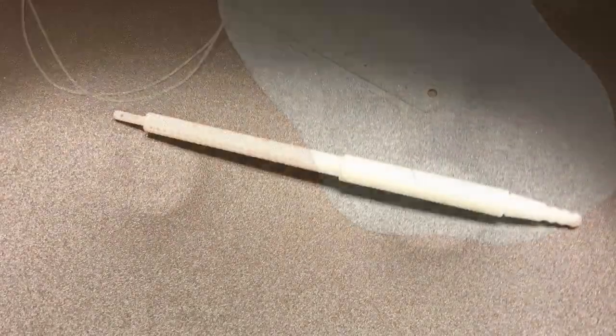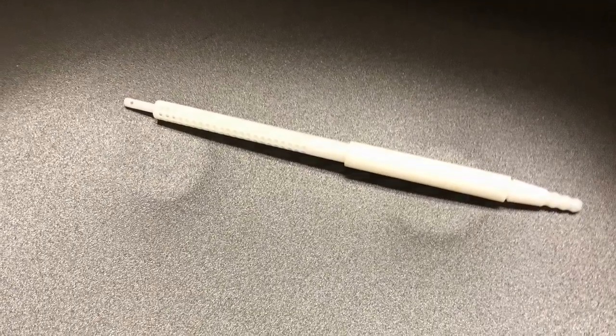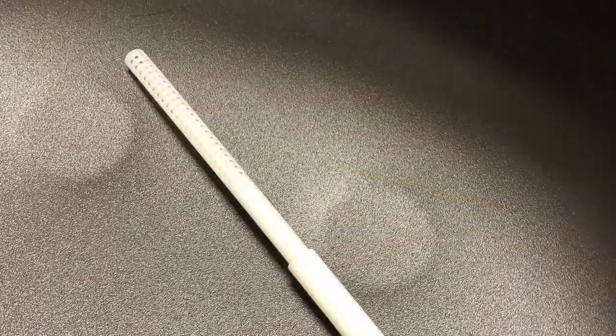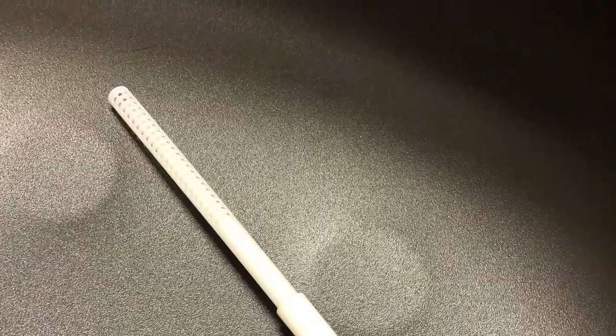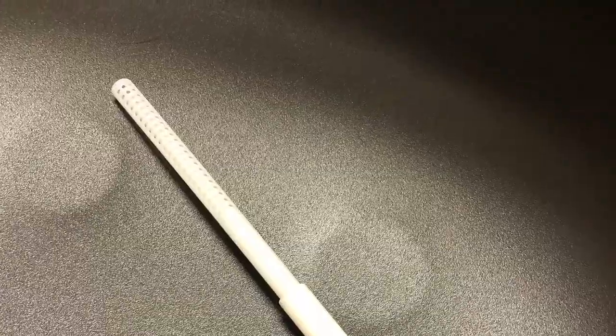The Pool suction tip. This suction tip allows for abdominal cavity suctioning. This can be used in two ways: pinpoint opening, suctioning for smaller areas of suctioning, or multiple openings to remove large quantities of fluid or irrigation from surgical sites. It's used in many abdominal surgeries. Our sample is disposable, however, there are metal ones which are reusable.